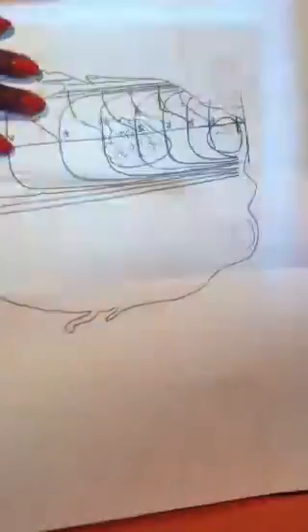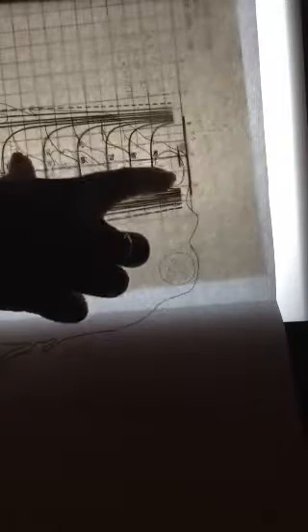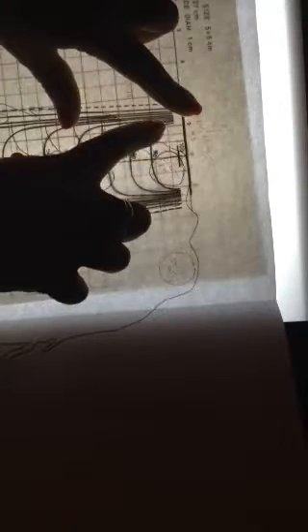Okay, so here's one that I've already done. Turn the light box on if I can, so you can see. So what I did was, again, I put the isodose chart on this part of the anatomy, and I chose to do 3 segments on this side. I left off that segment because it's so small. So I did this segment and that segment using the grid lines, and then I added a sub-segment.